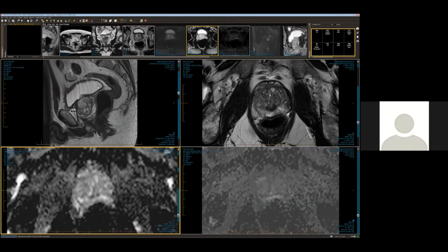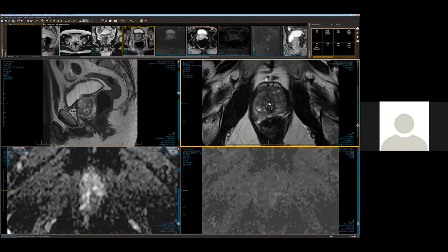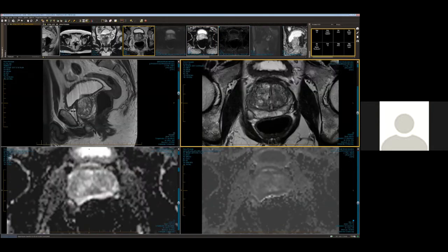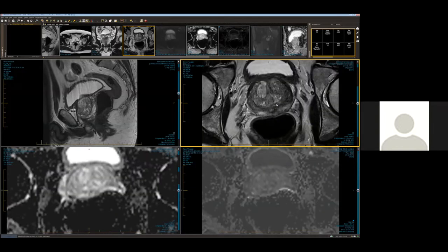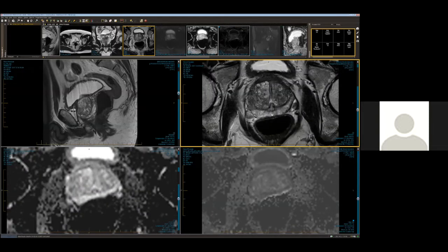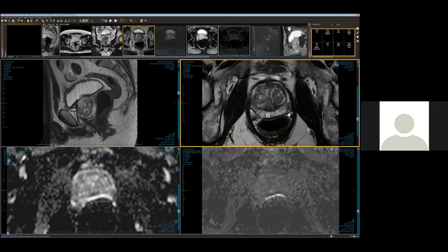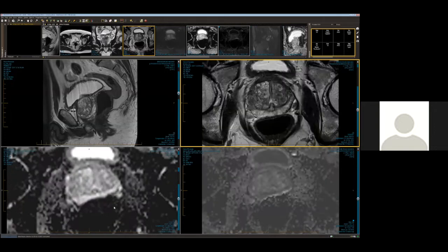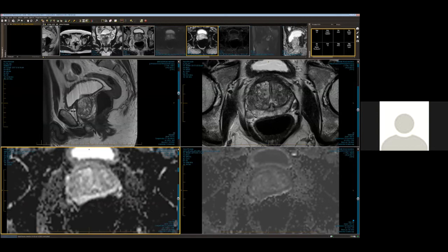So the prostate volume is 40 cc in this patient. You can see as we go through the actual T2s, the top right-hand corner, this typical BPH appearance, nodules that are hyper-intense and hypo-intense, but all well-defined with some minor linear abnormal signal intensity throughout the peripheral zone on the T2 images. There's a little bit of rectal air obscuring the base on these pictures. You can see the rectal air in the sagittals. But there's no focal area of restricted diffusion.